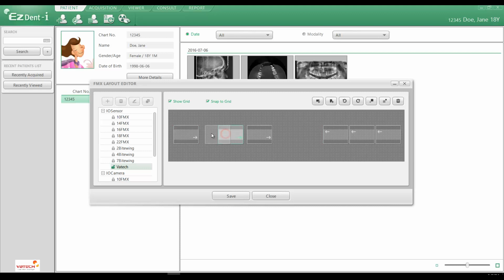We can then move these around to lay it out aesthetically, and then from there, if we wish to, we can add 2 vertical ones. Left click and drag it into place, left click on the second one, drag it into place as well, and then again we go ahead and assign it and lay it out so it's laid out symmetrically from an aesthetic point of view.